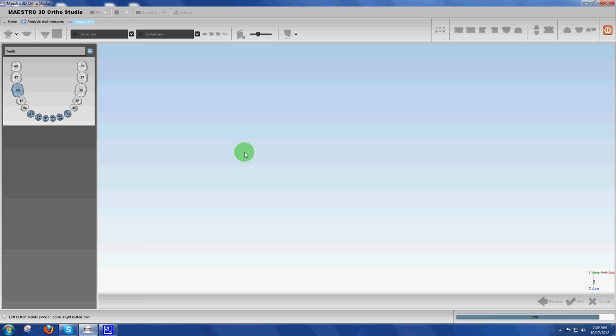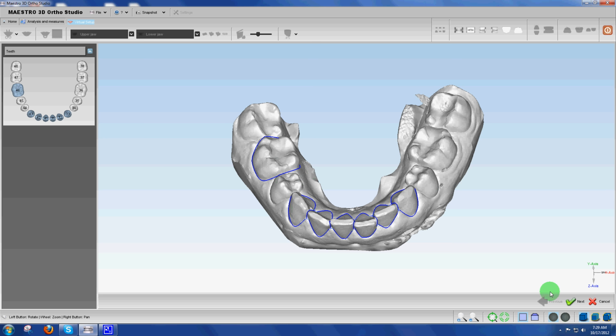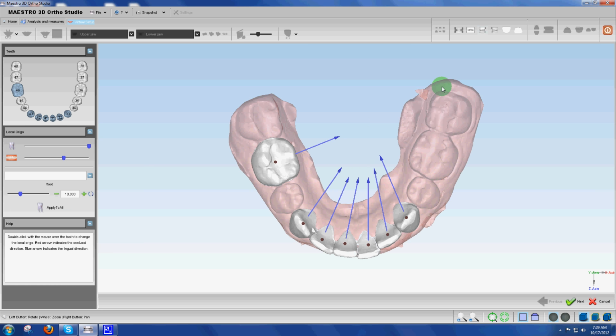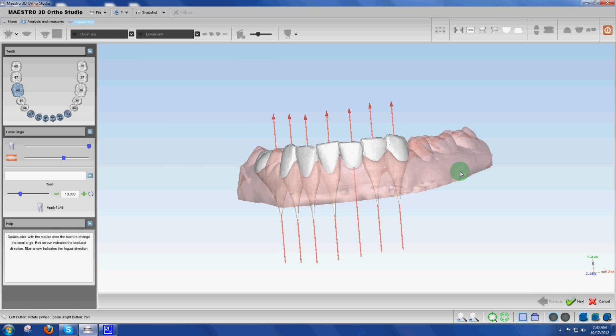And we are almost ready for our setup. So once again, our last shot at correction, and everything looks good. And here is my lower model. Looks like there may be a little glitch here.